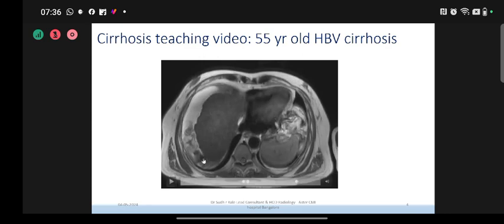In those images, what you see is a T2 weighted image with fat suppression. Similarly we do it for T1 weighted with fat suppression. So remember, T1 for anatomy, T2 for pathology, and in T2, whichever lesion becomes brighter is considered to be pathological. And thirdly, you have diffusion weighted images and contrast images. If you know these four sequences, it helps a lot.